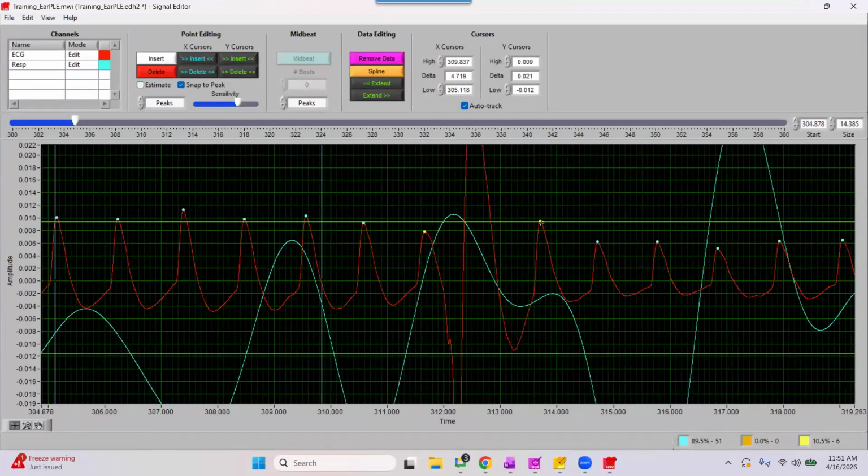What I can see is that, again, I have this gap or spacing of time, and I have a defined systolic peak here. Movement definitely does start to affect this waveform, but our systolic peak is still well defined, so this cycle, although affected by movement, is still usable. We are going to take these two anchors of our pulsatile waveform that look good, and take our blue X cursors and put them on the outside of the pulsatile waveform that checks all of our boxes.